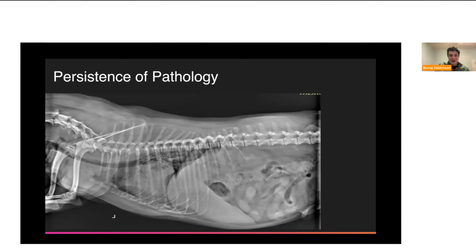These are completely collapsed down here. And that's another form of dynamic lower airway collapse that you can get with usually small breed dogs like the Yorkshire or poodles, mini poodles, and things like that, Maltese. And so in this case, this is the reason for this very poor pulmonary inflation: the dog cannot open those lower airways up to inflate properly.